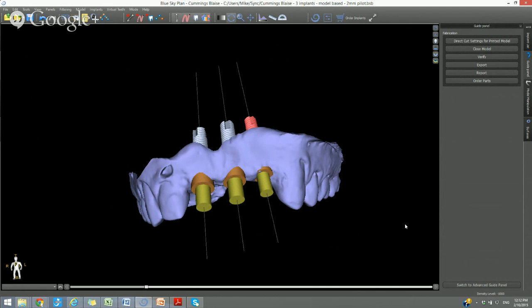Okay, so the software, all the settings and all the configuration have been set to hold the metal cylinder, to work with the proper drills. It's all there. Now we have a couple of other buttons here. Let's take a look at what the other buttons are for.